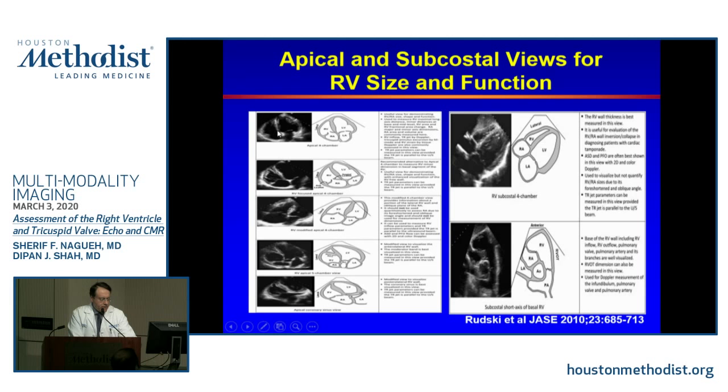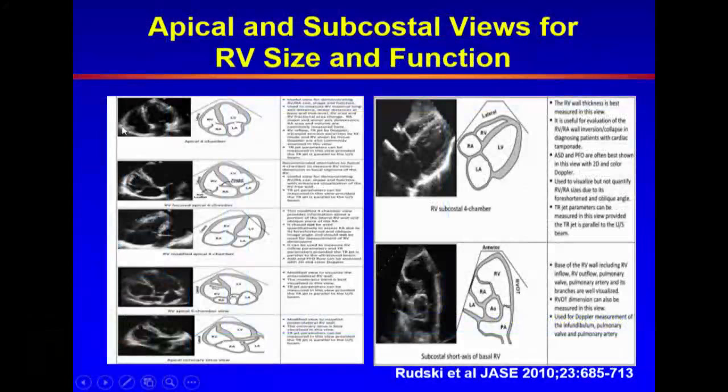When you look at the right ventricle, you are able to see what is happening with the free wall, if you can. Sometimes the use of contrast for one reason or another can help you visualize the RV, and then we have other views that will show you more of the RV free wall. You get to look at the tricuspid valve, interrogate the tricuspid valve, color Doppler, look at the interatrial septum as well. This is the view that we depend on to get TAPSE and to get the S prime, tricuspid annular SM velocity, as indicators of RV systolic function.